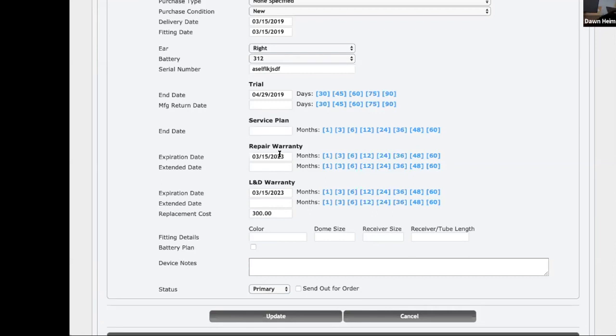Or this way, if the warranty letter we forgot, something screwed up, there was a hiccup in our office, we didn't send it out, and they're upset with us, and we're like, oh, actually, we're good. We still have a few more weeks, days, whatever, before the warranty goes out. I think it's just easier if they look at this and all the dates line up. The day of the fitting, you've got 4 years from that point. That way, if you're bundling them, the day of all of their services goes to that date. Everything just lines up nice.